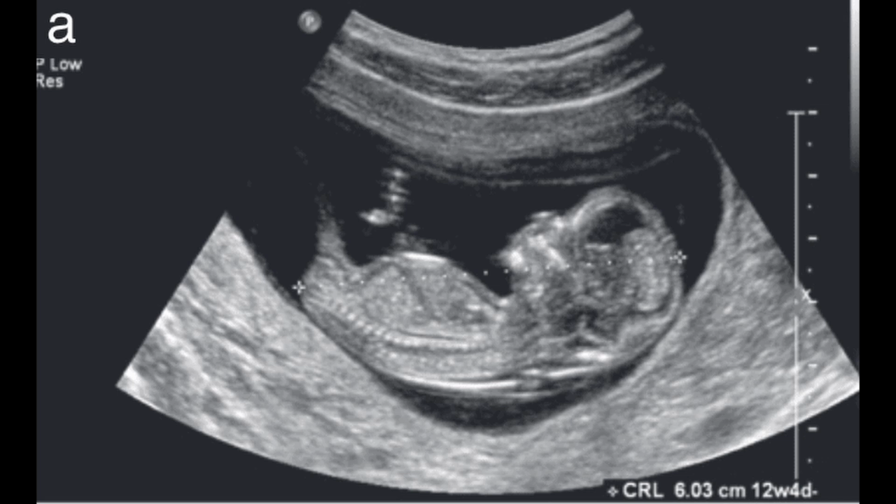And if it's an obstetric scan, we're on the hunt for a tiny human-shaped blob. We'll check the baby's size, heartbeat, and make sure everything is going according to the manual.